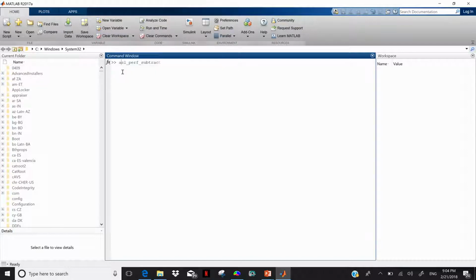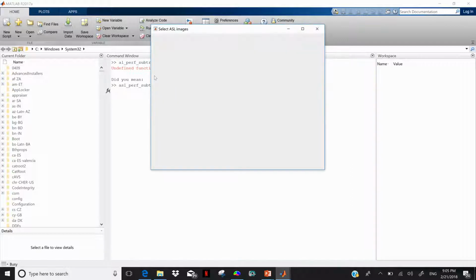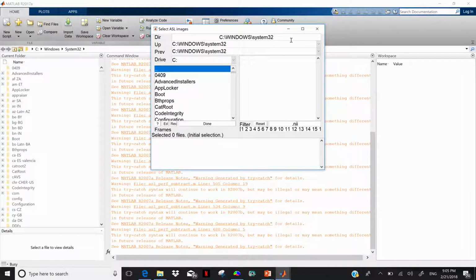For example, if this is the command and you miss an s, then this won't get executed, and it will identify something and tell you, do you actually mean this, and you say yes. Now you click on it, and another window is supposed to pop up right here. Now you just copy paste your all right, it has forgotten it.